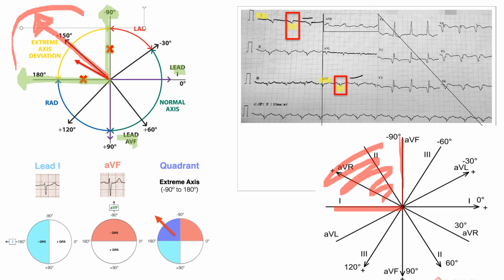This is very, very rare, and most of the time it could be just due to placing the electrodes incorrectly. It can cause such an altered deviation. Let me just show you the method of shading it. So let's shade it in together.